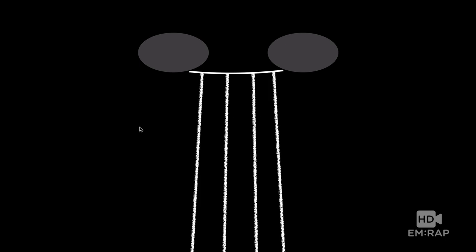So let's look at this super high-tech drawing here. This is a rib, and this is the pleural line right here. These things down here are called A lines. They are horizontal reverberation artifacts that are generated when there is just air beneath the pleura. A equals air. An A line means not pulmonary edema. In contrast, these vertical artifacts here are B lines. They mean that there's extra fluid in the lungs.